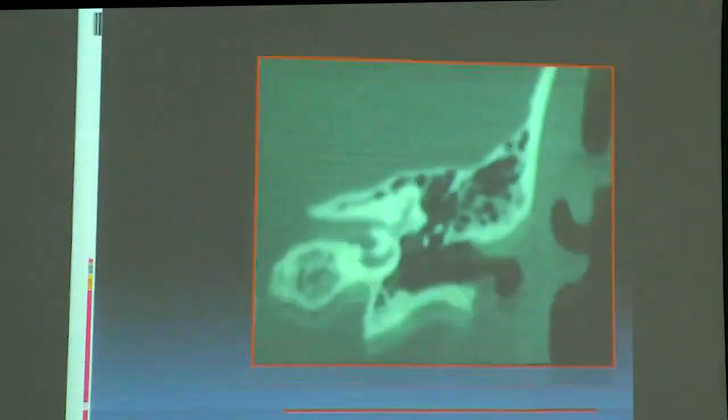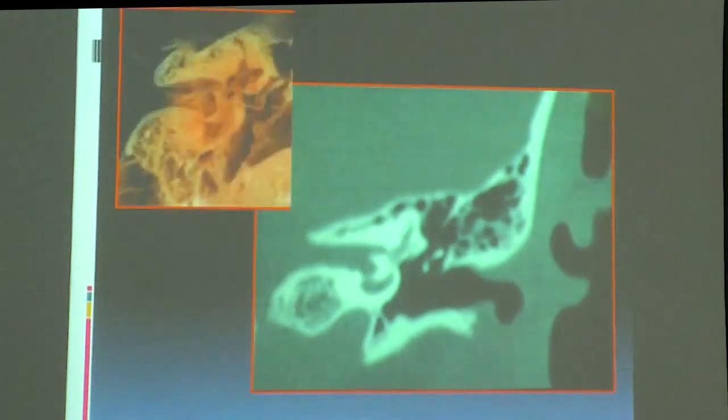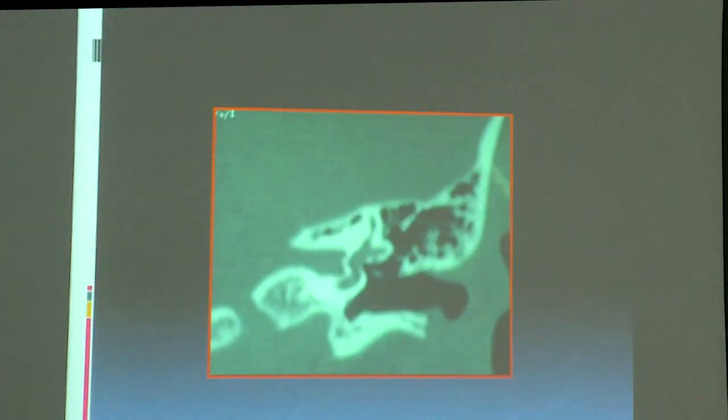Here we go a bit posteriorly and then we can see this is the superior vestibular nerve, this is the inferior vestibular nerve and this is the superior semicircular canal, lateral semicircular canal and hanging like a grape we see the tympanic segment going to become the mastoid segment of the facial nerve, right? Because it is within the dome of the canal that this is going to happen. So you see it more distinctly here as the lateral canal becomes very prominent. You can see the facial nerve just hanging below it. Okay, and this is the superior canal.